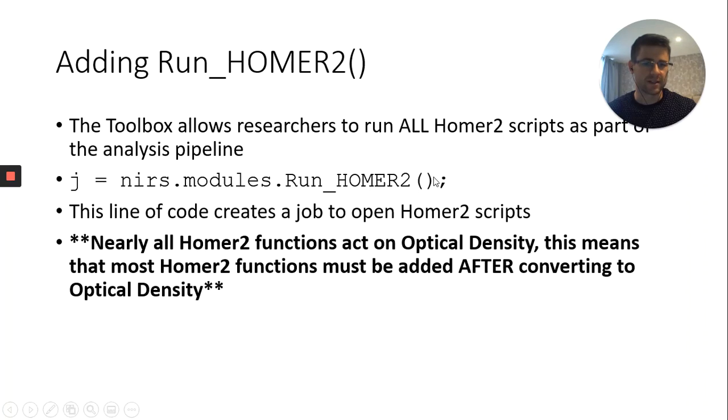You call it empty, which would allow you to start your pipeline with this. If it's not starting your pipeline, you would have the previous output from the previous module put into this function as the input. So here we're initializing our pipeline. We're outputting it as j.